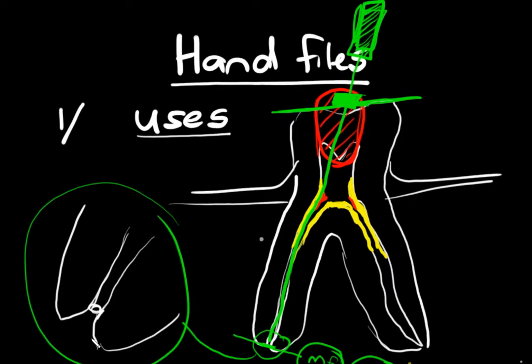So that constitutes the major foramen there. This is inside the canal here, and this is outside the canal here.